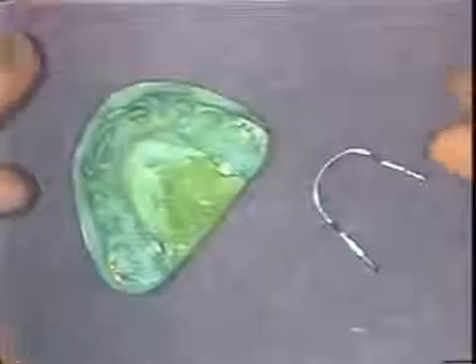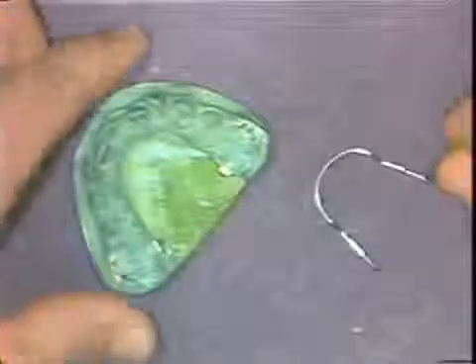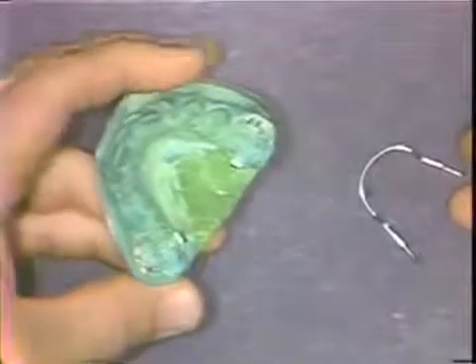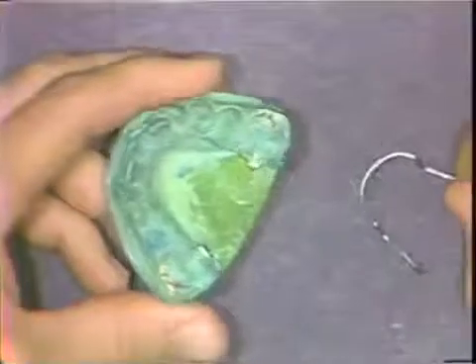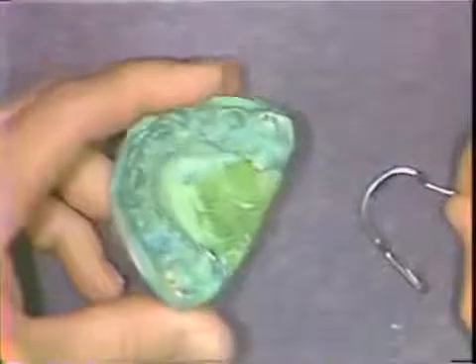One of the most useful auxiliaries used in clinical orthodontics is the addition of the horizontal lingual arch in conjunction with fixed, cemented to all the teeth appliance.